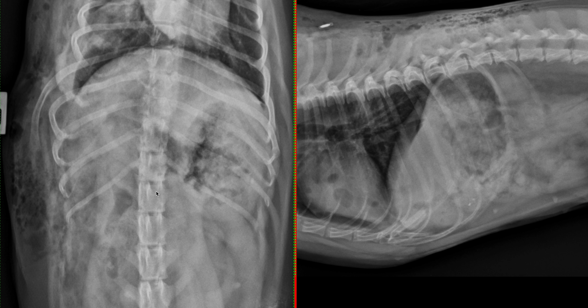Additionally, trauma to the right cranial abdominal wall is a possibility given the suspicion of gas contouring to the liver. The regional loss of serosal contrast can reflect regional hemorrhage. In a short period of time since the attack, an inflammatory effusion is considered unlikely.